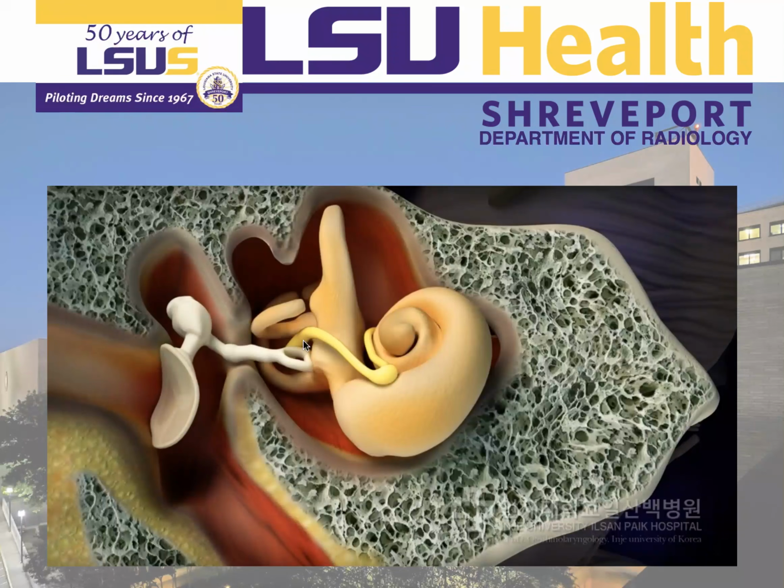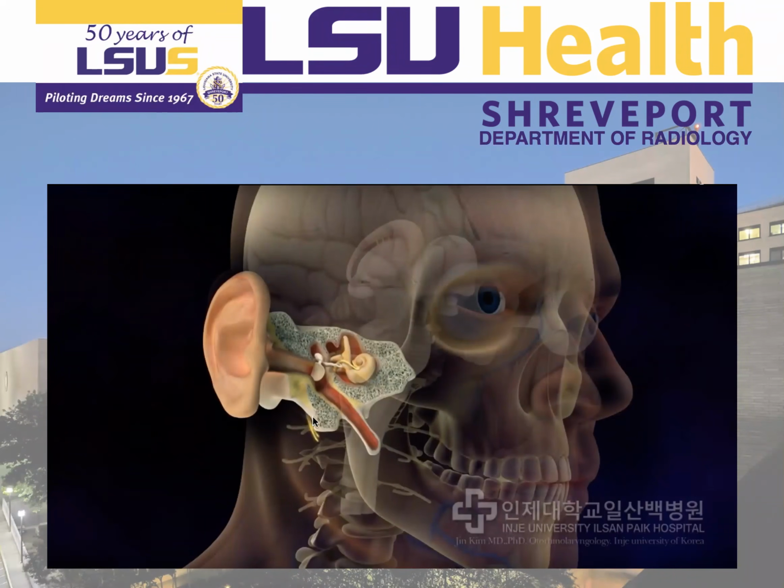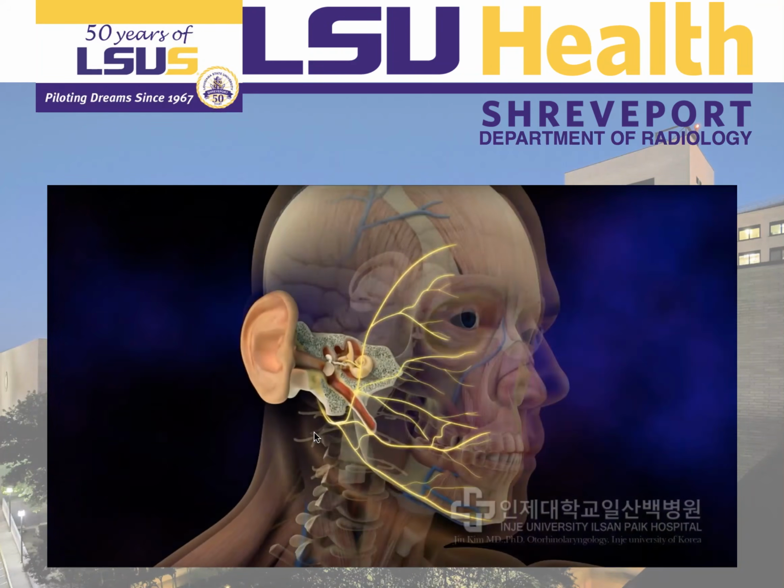On its way to the stylomastoid foramen, it passes under the lateral semicircular canal. Now, having passed the stylomastoid foramen, it passes through the parotid gland and gives its branches to the face.